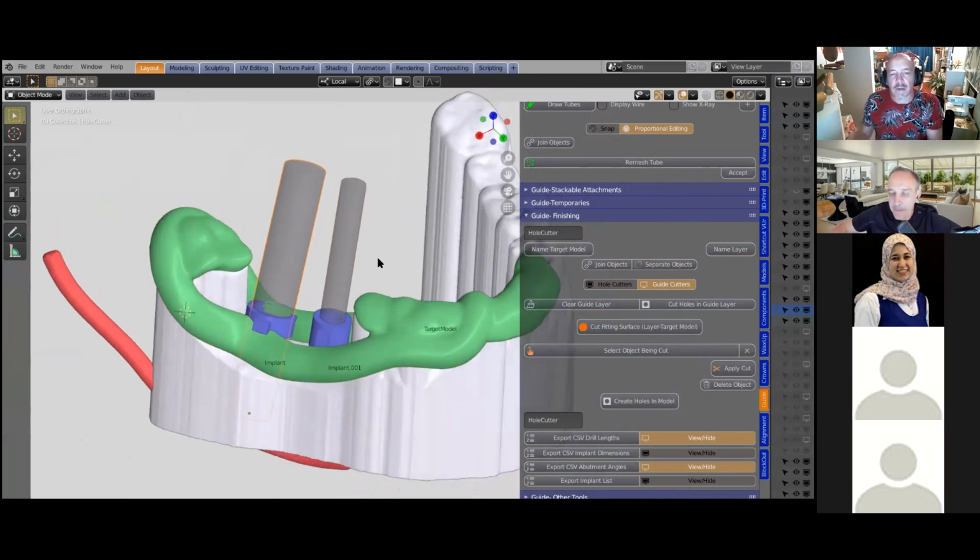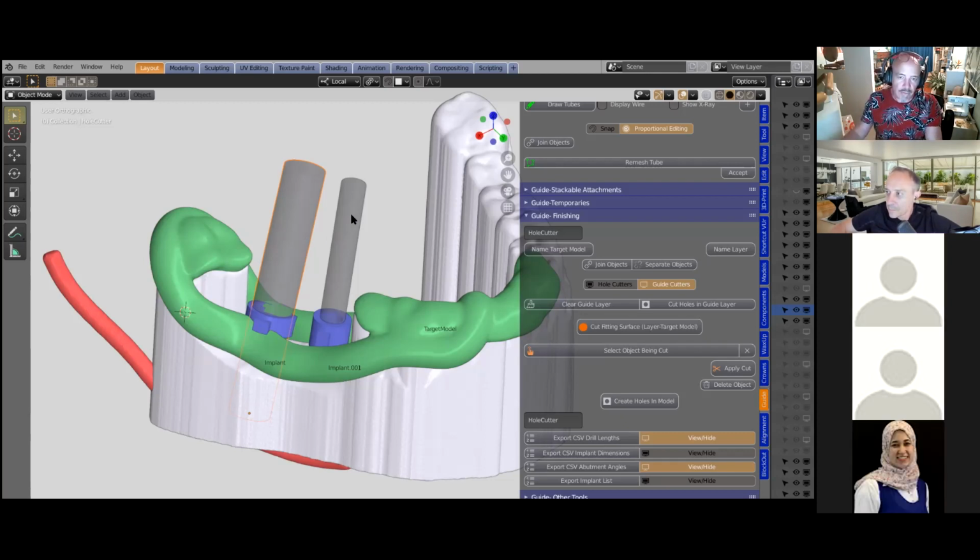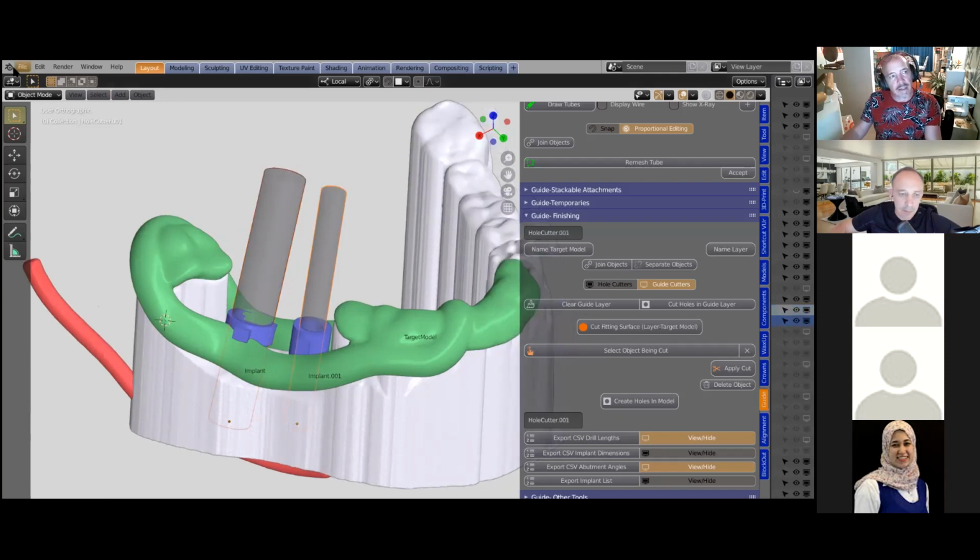So this cuts into the guide layer or the skeleton guide. Here's the thing: you need to select which ones you want to use to make a cut, because behind the scenes it duplicates our selection and makes cutters. This is just a visual exposure of our cutters. So I'm taking the one, shift left click to select the other one. Let's save, file save. You need to make sure that this is called layer, otherwise it's not going to cut. If you're working with 3 different layers or 4 different stackable ones, you need to make sure each is called layer.